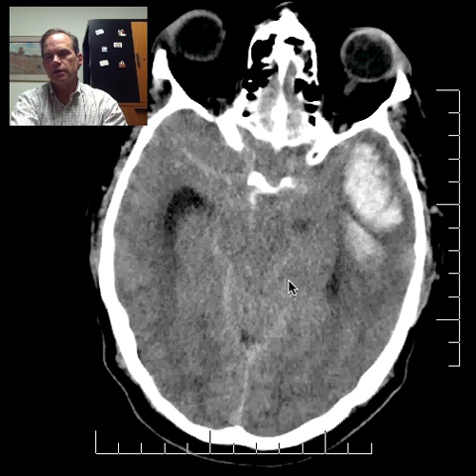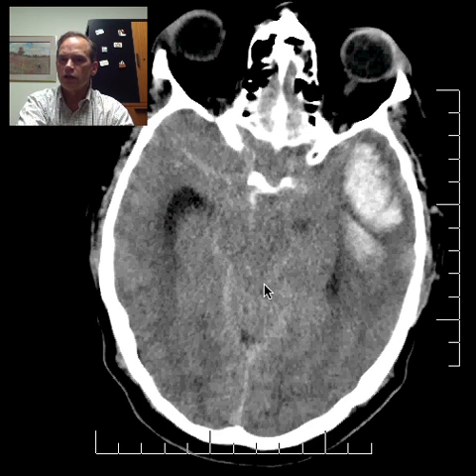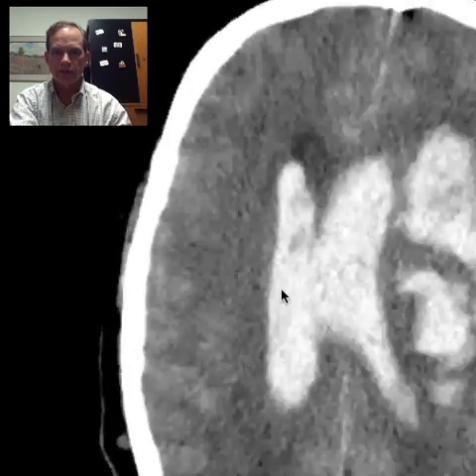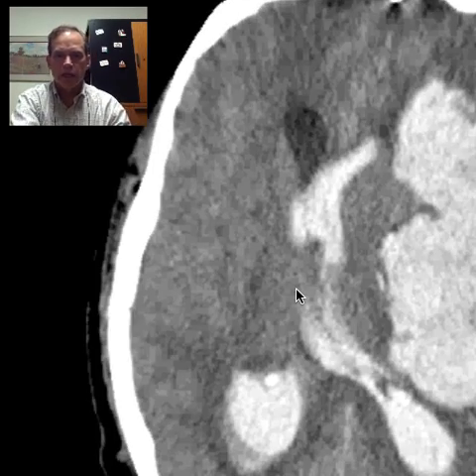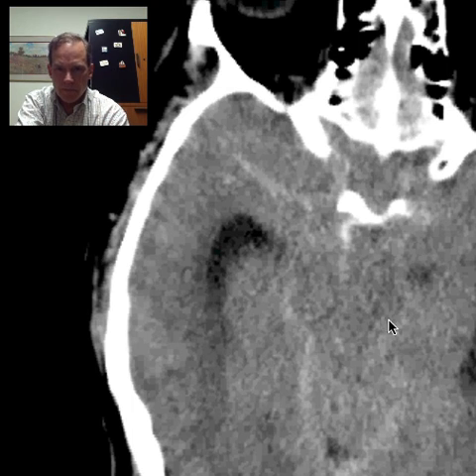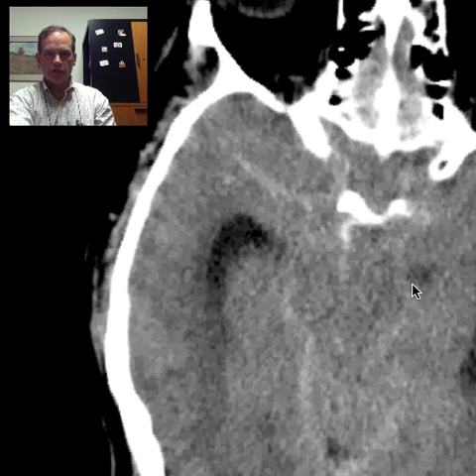And it's there where the temporal lobe is kind of sitting along the tentorium, that this uncus of the medial temporal lobe can push over medially and then hang down. And here again, if we look there, even though it's not ideal, you can see maybe that you have a lobule of tissue coming from the temporal lobe.